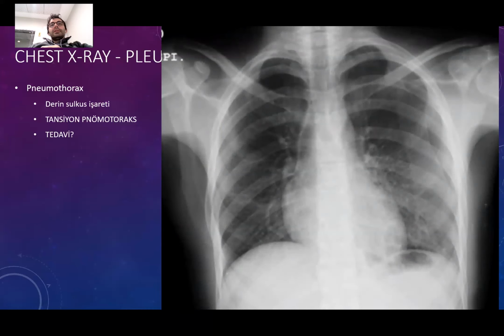Can you see the abnormality in this scan? By the way, you will have a lot of patients with pneumothorax in your oral exam. I want you to be clearly visualizing these lung markings in a case of pneumothorax. This is a very important thing, that these patients are going to come to you on a very busy day, a very young patient, you're not suspecting anything, and these patients usually have very mild symptoms like a little bit of chest pain, but it's actually something pretty dangerous. This can easily progress to a tension pneumothorax and be life-threatening.